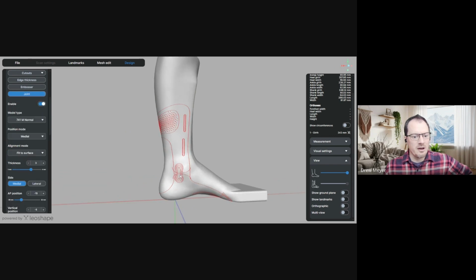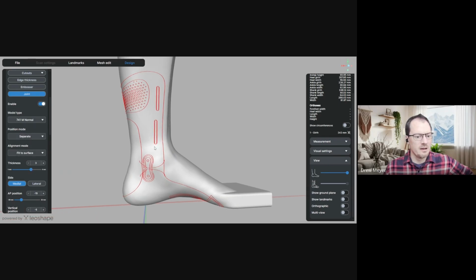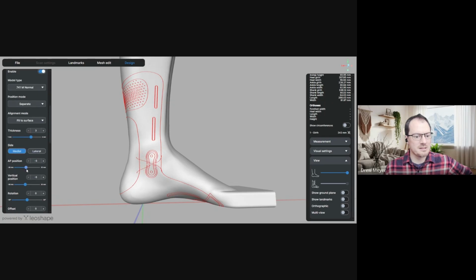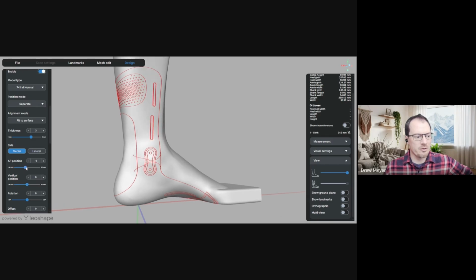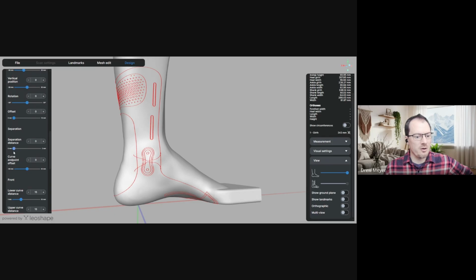With this tool, you can pick where your Tamarack joints are going to go, how they conform to the model, and you can independently place those Tamarack joint positions. So you can change the AP and the ML of those joint locations, and you can change how the curves are going to be, the cutoff curve, how that is going to be shaped.